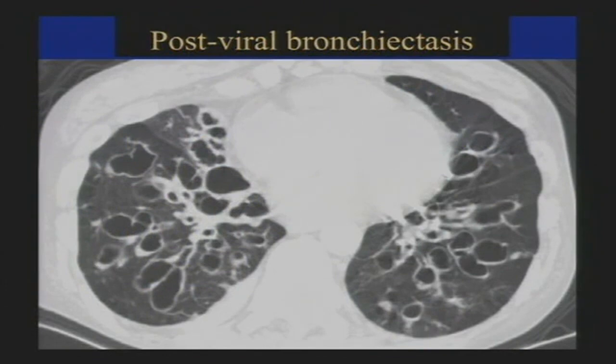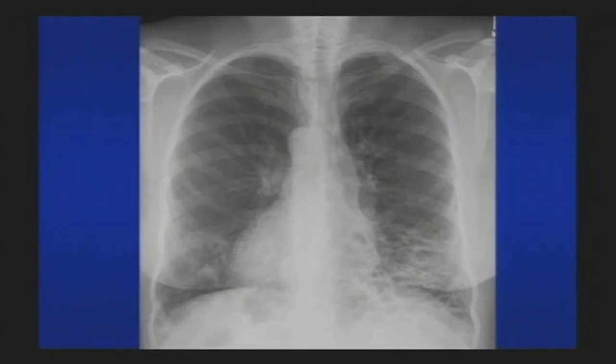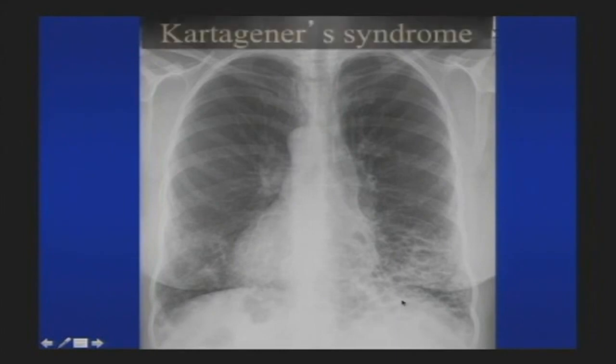Okay, here's an example on chest x-ray of some circular-looking abnormalities at the bases. Some of these look kind of nodular, probably because there's some impaction and filling of the airways with mucus. What's also striking about this case, I did not intentionally flip it. This is not photoshopped to be flipped. This patient has situs inversus, so a combination of very severe airways inflammation at the bases and situs inversus, Kartagener, however you want to pronounce that, I'm not even sure what the real pronunciation is.